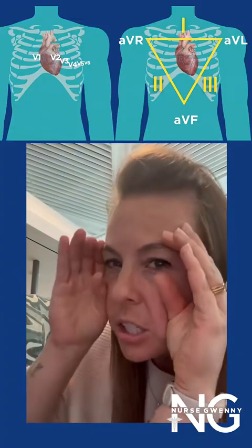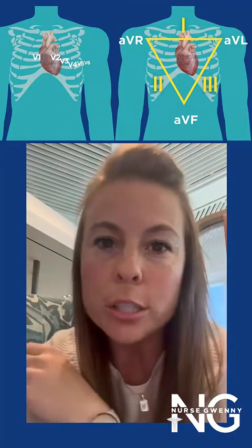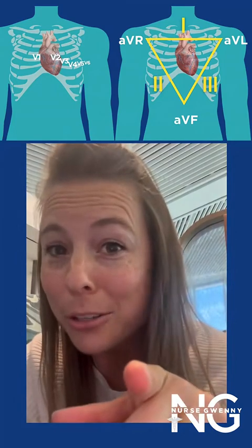Okay, so if we're positioned at AVR, we're looking at the right upper side of the heart. So look over that, push on the screen to pause it so you can see where all of those leads belong.